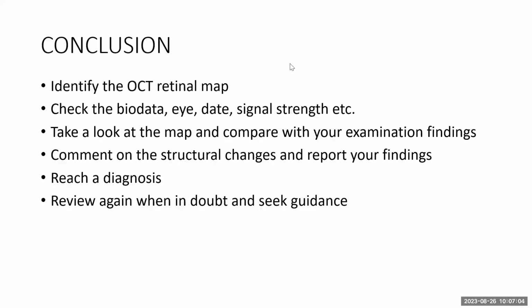Okay, we have the first question here. Can you see it, Dr. Umeh? Question: is there a way to differentiate between drusenoid from hemorrhagic PED on OCT?